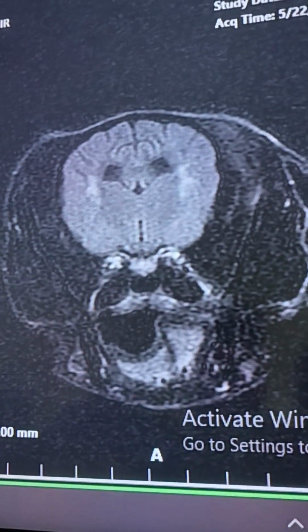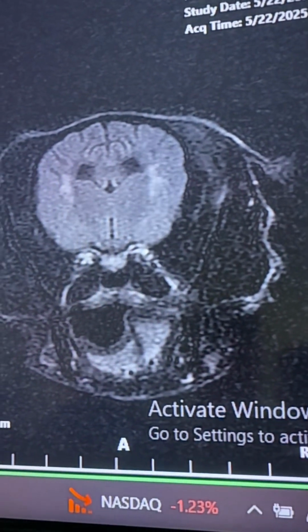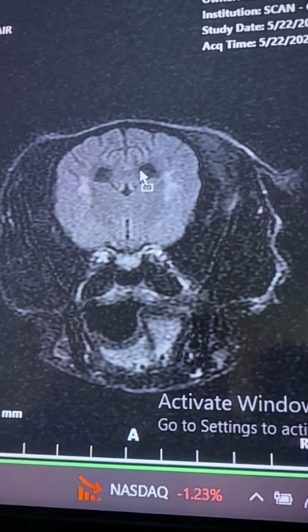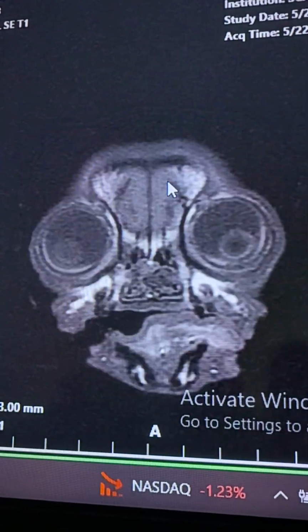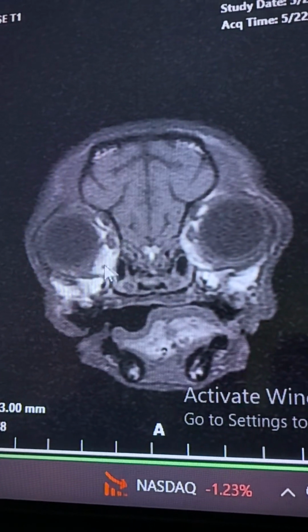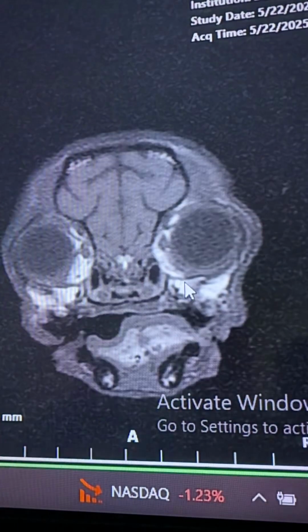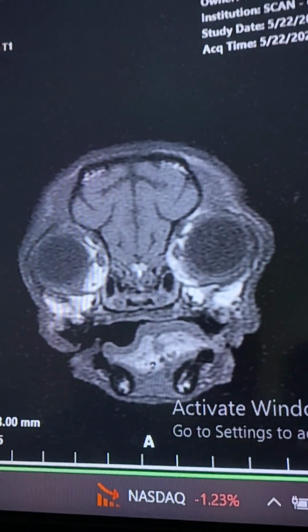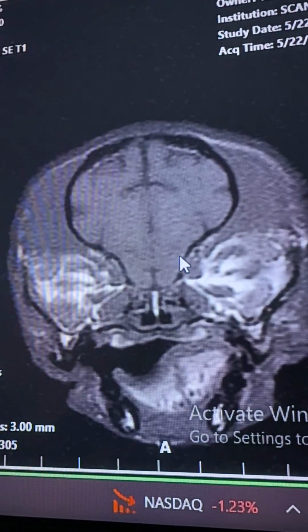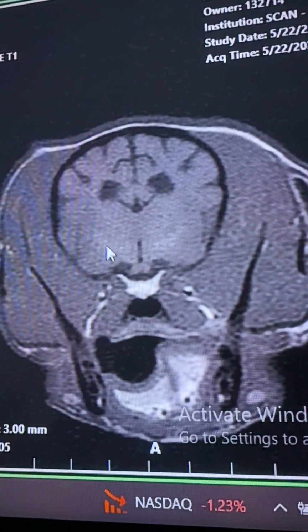And what prompted me to look at the ammonia was we were getting through the MRI here. And this is called a T1 weighted sequence. Basically all tissue is going to be gray, and then fat is going to be white. So this is what we call our pre-contrast. We want to compare pre and post contrast. And what caught my eye on her on this sequence is you see the brightness down here? It's so subtle, but it's there.